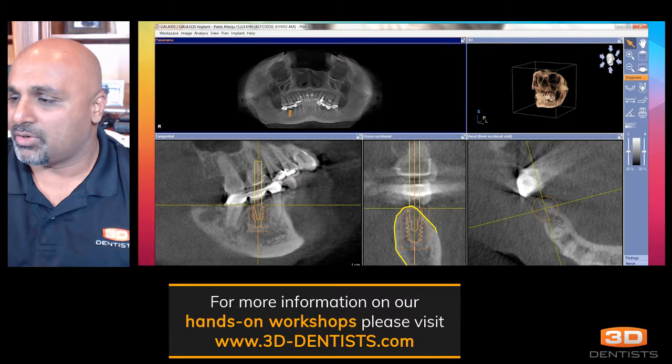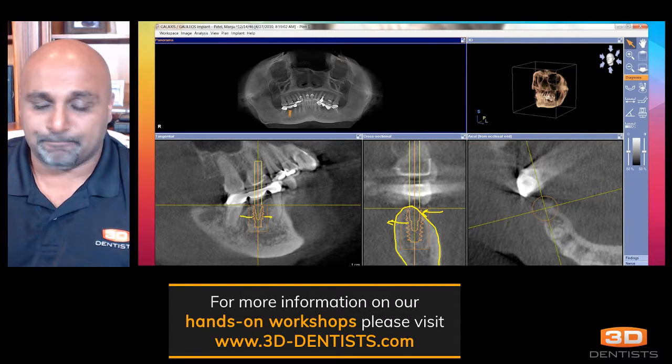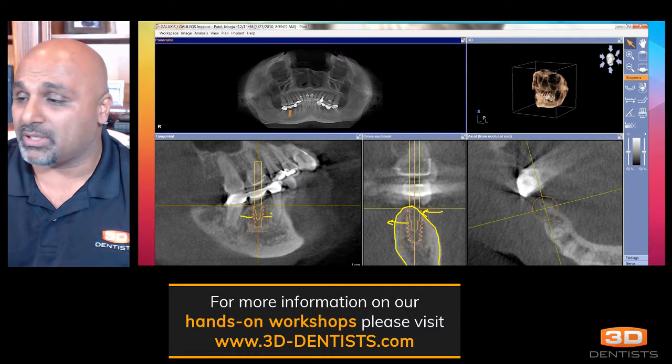Okay, certainly we can see maybe this part of the thread is outside of the bone, and oftentimes if we're looking at this from a pure surgical perspective, we would have a tendency to bodily move this implant that way. And the other thing that we look at here is that this implant is well centered between the teeth. So we can make some minor changes to this and think that we have a good plan here.